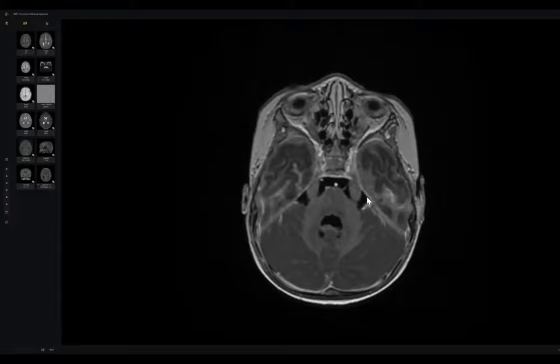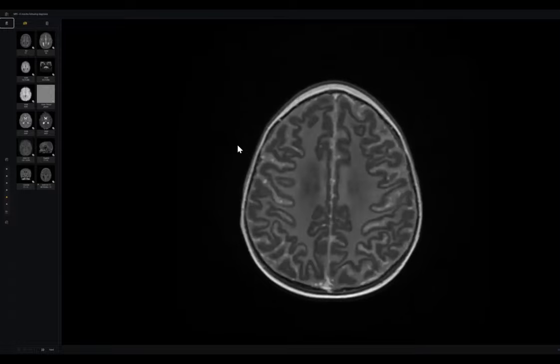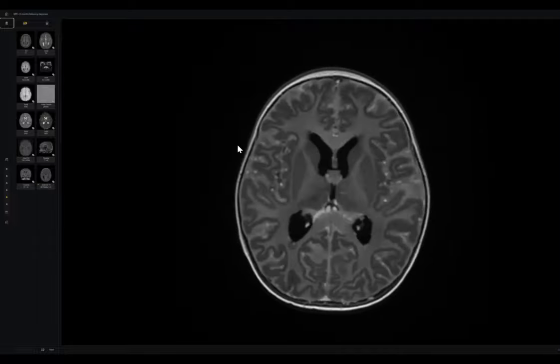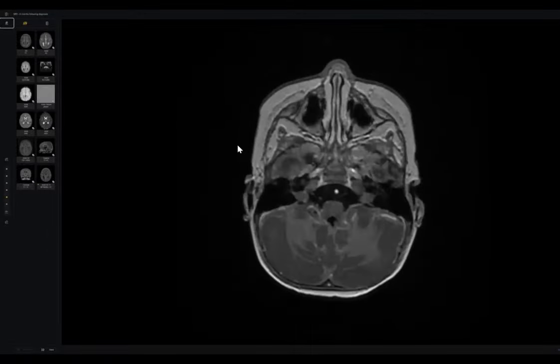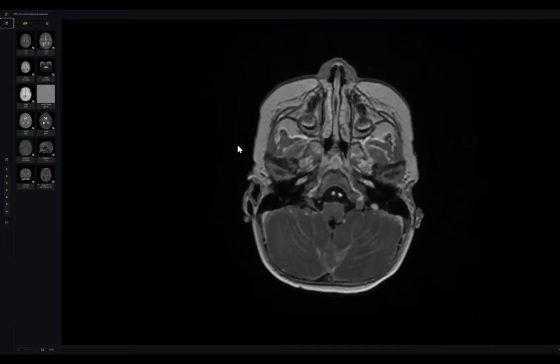So in conclusion, you are concerned about leptomeningeal drop metastasis. Did you find the primary or not? I was not able to find the primary. In this age group, 1 year old, what is the expected primary? I would have thought of medulloblastoma. Medulloblastoma is possible, as are choroid plexus papilloma. What else? ATRT, atypical teratoid rhabdoid tumors, are a possibility.